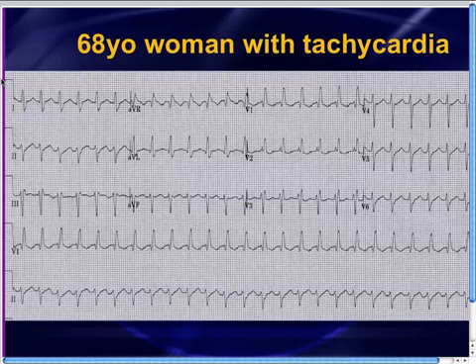Well, the first thing we're going to do is we're going to look very, very carefully. She's stable, by the way. If she were unstable, who cares? We'd go right for electricity. But she's pretty stable. She's just laying in the stretcher chilling, saying, "Why are you guys worried about my heart? I'm here for my foot."